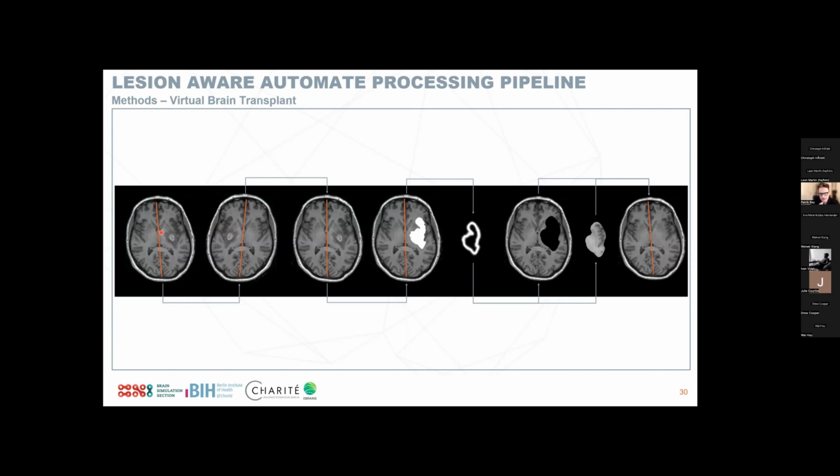But if we want to use this idea of symmetry, we need it to be perfectly aligned in the midline to be able to actually swap the sides. So the first step is we mirror the actual image, and then we register this image to the mirror image. So basically what we're doing is we're solving for how do we get from this left tilted image to the right tilted image, and what is the warp that we need to apply here.